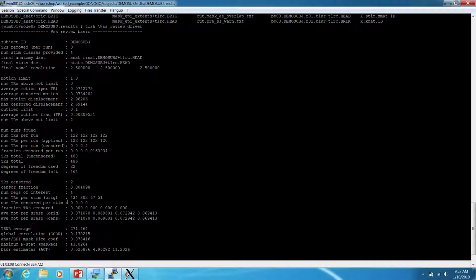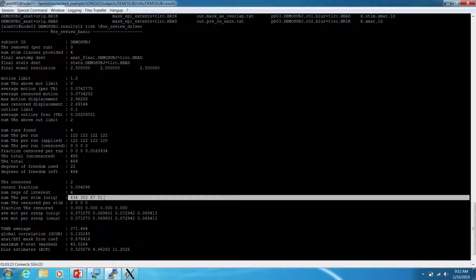But the one that I use the most actually is this secondary set. So now what it does is it breaks it down. For our stimuli that we ran, this is how many volumes of each of the four regressors that we put in. This is how many volumes were related to the convolution of their hemodynamic response. So anything from when the event happened, any volumes that were part of that occur over the next few scans. This is how many of those went into each of them.